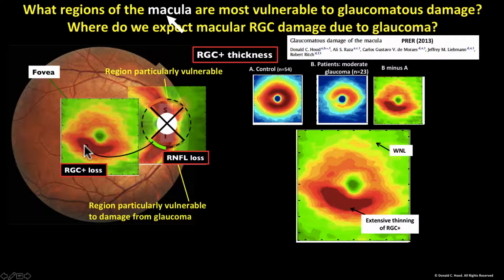The important point I want to emphasize here is ganglion cells in this very vulnerable region here, they send their axons right smack into the most vulnerable part of the disc, right? That's the reason for the macular vulnerability zone. Or actually, that's the reason for the loss in the inferior macula here. It's because those axons are going right into the macular vulnerability zone.